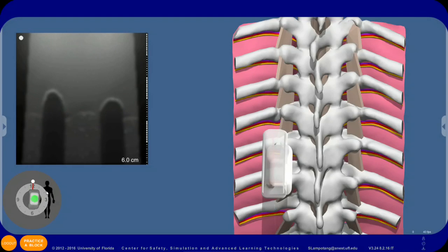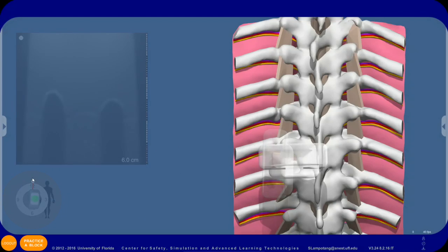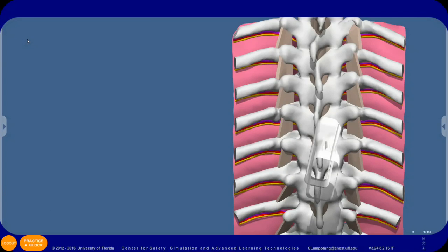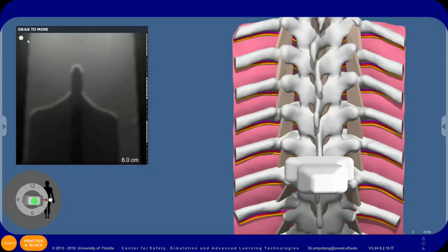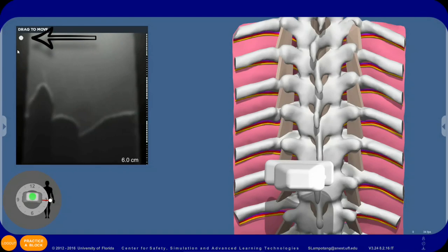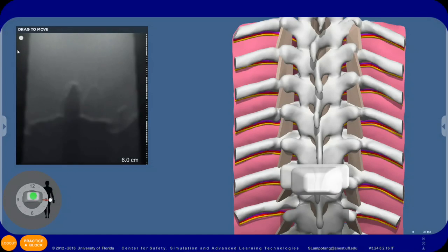If you notice on the cognitive aid, the level mark corresponds to the tactile marker on the probe. If you place the probe correctly, you will see the level mark to the left on the aid and the screen mark to the left on the ultrasound screen. If you place the probe incorrectly, the marker on the aid will be to the right, while the screen marker will be to the left on the ultrasound image.